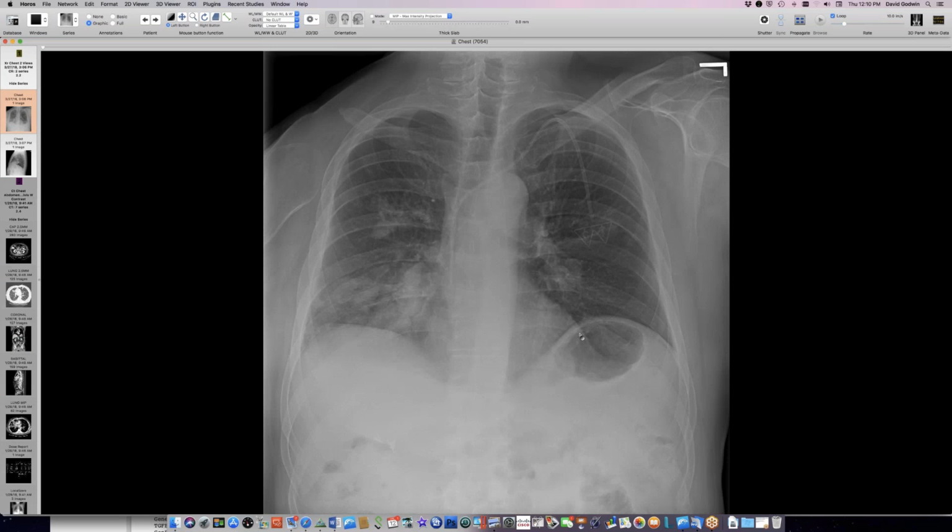So here's a fellow who's had, as you can see, a resection of his right shoulder here. He had an enchondroma, and then that was curetted and plated. This was in the scapula, and then things recurred and it turned into a grade 2 chondrosarcoma. And he has lung metastases. So at this point, this is current imaging here.